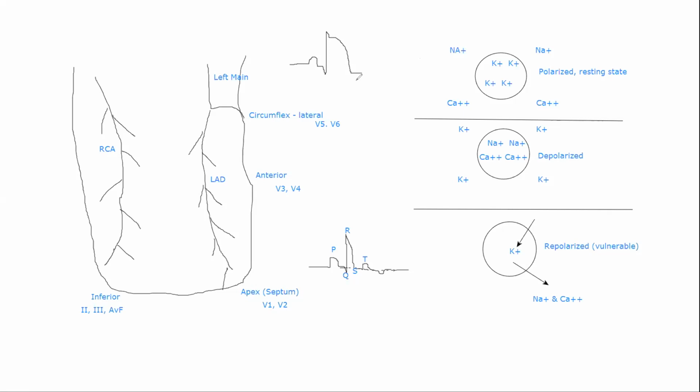So if on the 12-lead EKG the doctor says that there are signs of an inferior MI due to ST elevations, then what leads is this doctor seeing these ST elevations in, if they say that the patient's having an inferior MI? Leads 2, 3, and AVF, right? And what artery is probably occluded? The right coronary artery.